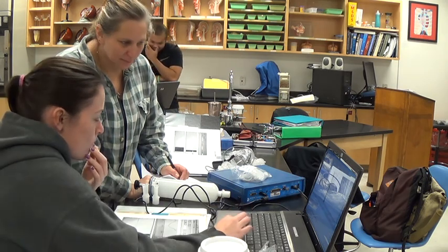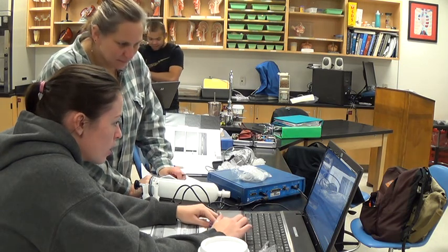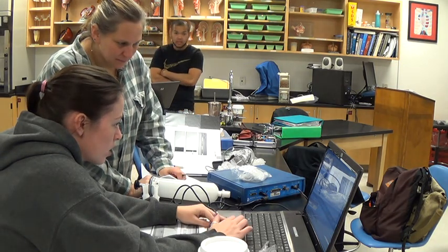You don't have to breathe as much down here. So this is the peak, the maximum inhalation, and then it takes me... I'm going to convert these to milliliters later.